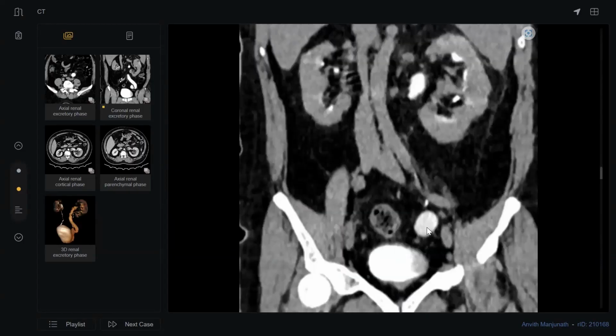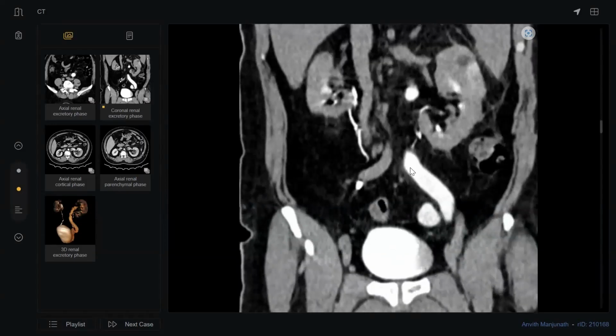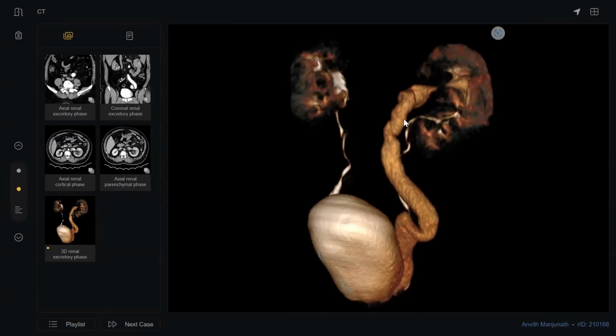So there are subsequent marked hydroureter nephrosis. But the lower ureter, the lower moiety ureter, has the orthotopic or the normal insertion in the trigone, where we can see here. Okay, here. This is the upper moiety. This is the lower. Okay, the upper ureter here is markedly dilated due to the pathology here, almost stenosis, because this is an ectopic insertion in the bladder. Sometimes it is inserted in the neck of the bladder. It is inserted not in the correct position. The correct position should be in the trigone here.